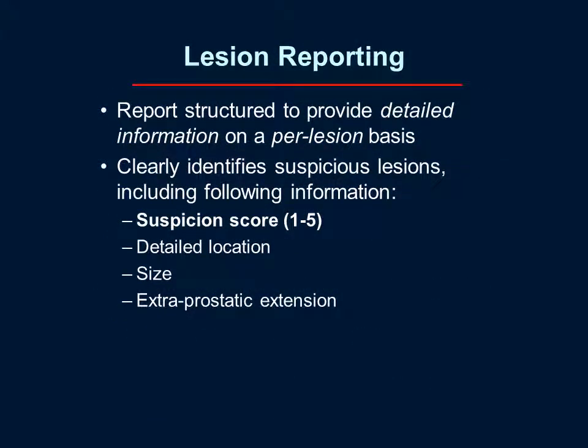PI-RADS calls for report structure to provide detailed information on a per-lesion basis. With this approach, we clearly identify suspicious lesions, giving for each lesion a suspicion score from 1 through 5, its location, size, and any associated extraprostatic extension.